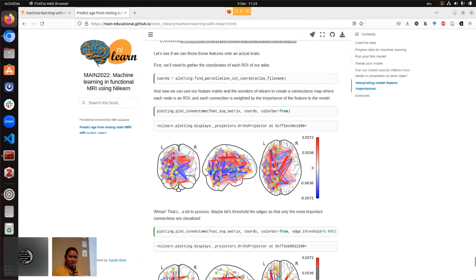So yeah, we have a really pretty transparent brain, and you can plot all the edges on it. I will explain a little bit why this looks a little wonky. First thing, why are all the centroids on the left side of the brain? This is actually because of the nature of the atlas. The atlas we use does not give you standalone parcels. It's a mixed atlas, more a resemblance of a network. So actually this function doesn't work very well.